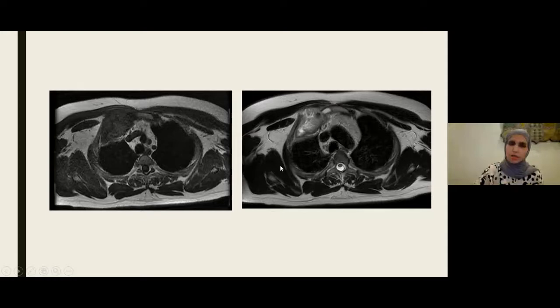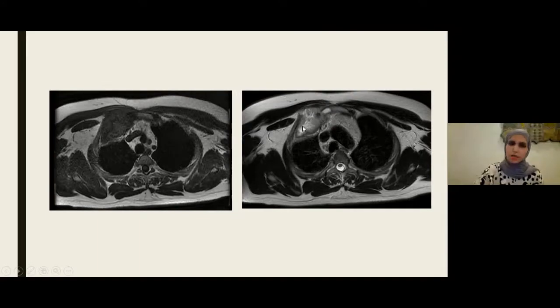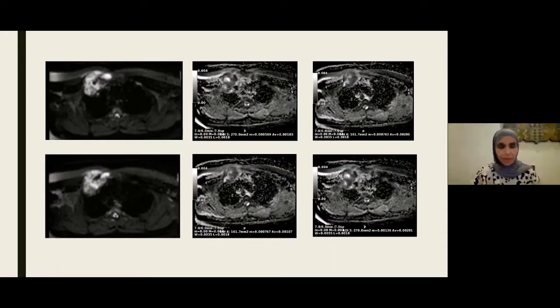However, T2 series shows a bright signal intensity within the center of the lesion, as well as a change in the marrow density of the adjacent sternum. Diffusion-weighted image showed significant restricted diffusion of this lesion with a remaining central area of non-restriction. The measured ADC value gave variable numbers of high and low values.